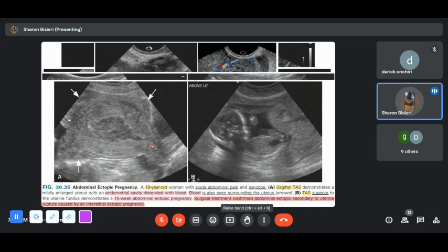And then the uterus appears bulky. Then if you look, it's surrounded by thin endometrium. So you have endometrial content. And actually, what you have is just the basal layer of the endometrium. The uterus is probably not bulky, it's probably normal size, but you need a measurement. If you were to measure it, maybe just 8-9 centimeters in length. But you have some free fluid in the POD, a little fluid surrounding it.